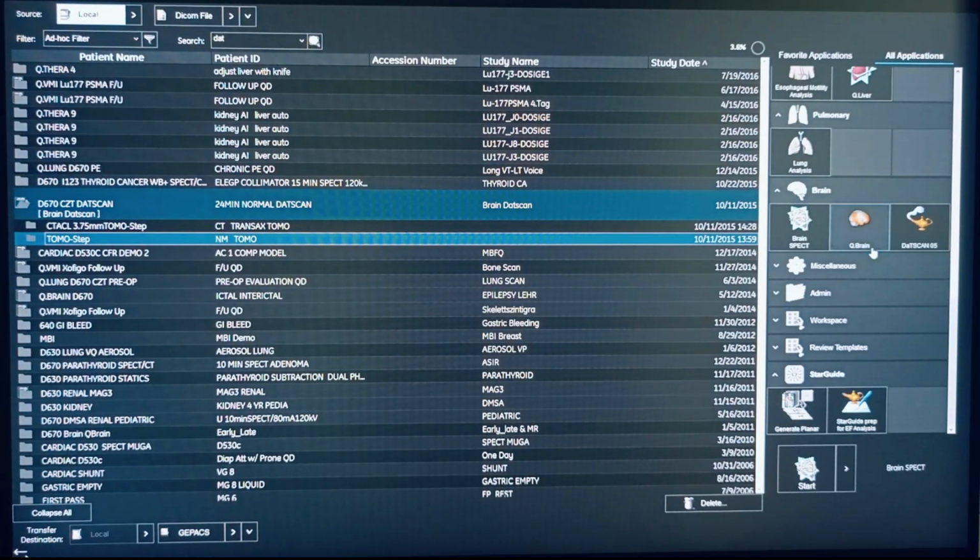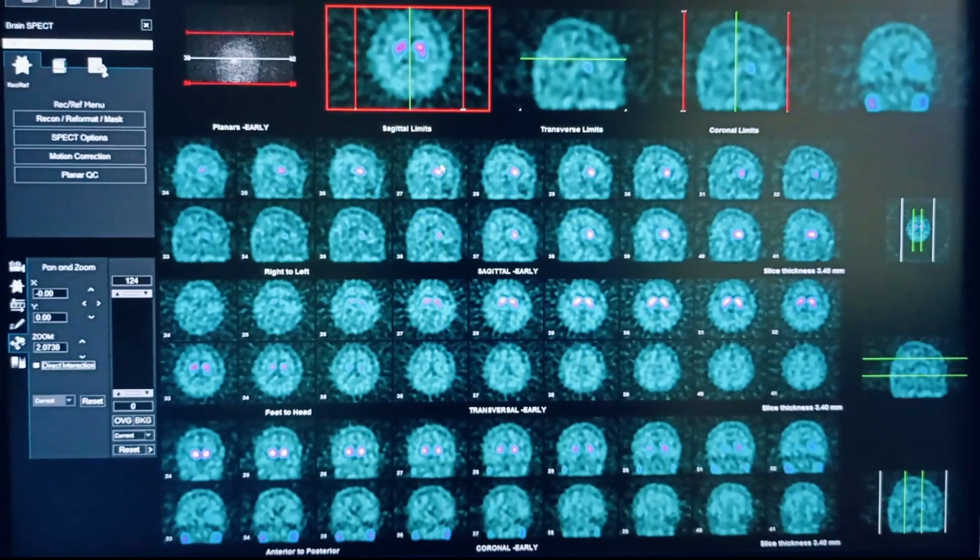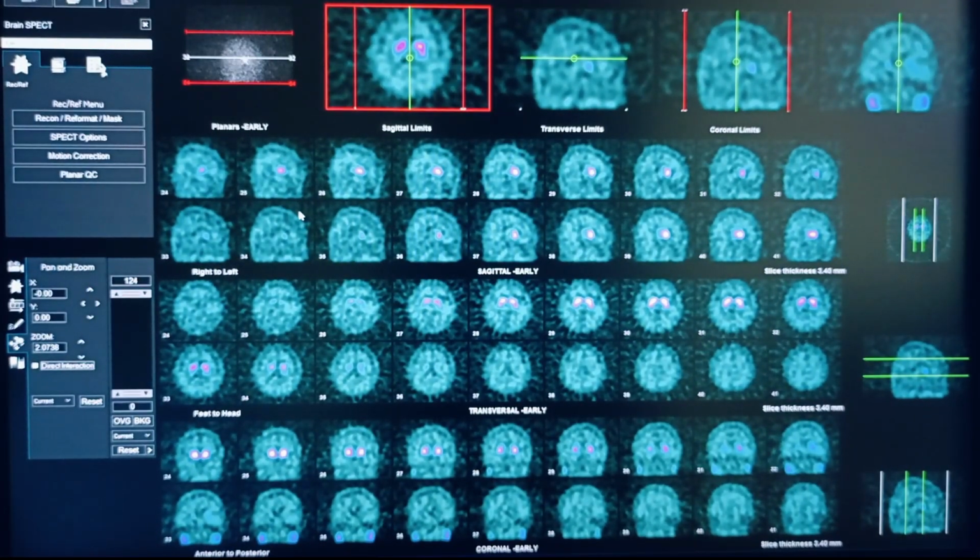Okay, now I will show you how to process TRODAT scan using this DaTscan application. First you have to process in the brain SPECT to generate the transaxial images. So this is the basic need. The result of this application will be the input for the second application.